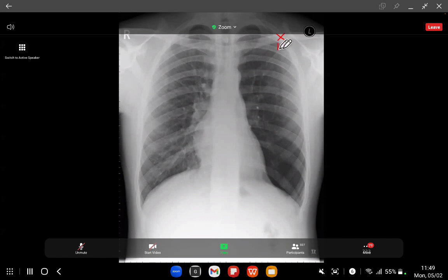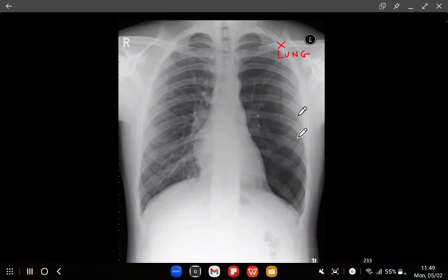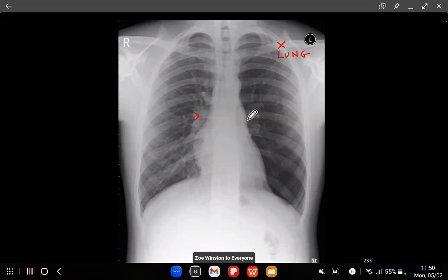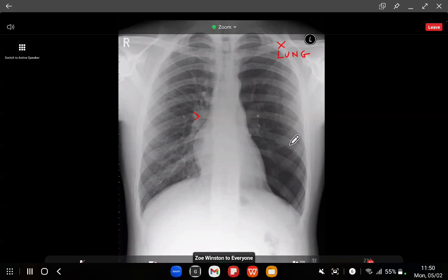And it's a lung problem, okay? Whereas if the number of vessels were equal on both sides, you're dealing with a chest wall problem. But the vessel reduction is due to the fact that it's a lung problem. Now, I can see the hilar point. I can't see the hilar point on the left side. And in fact, the left hilum is hypoplastic because it is tucked behind the heart border. And this is most likely to be Swyer-James syndrome.